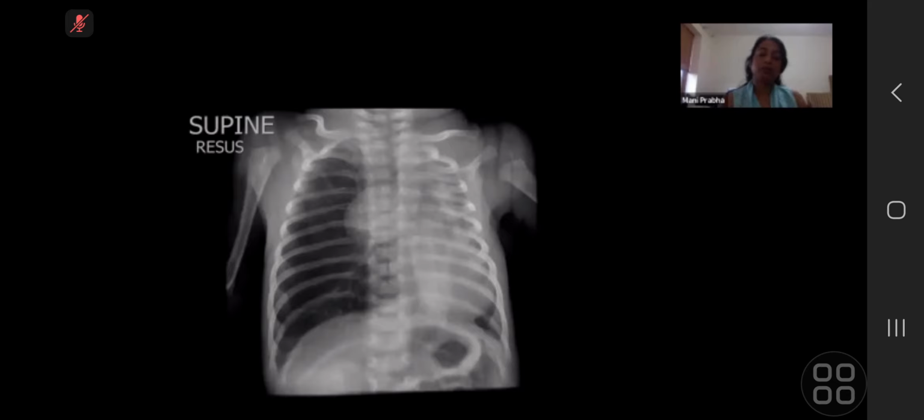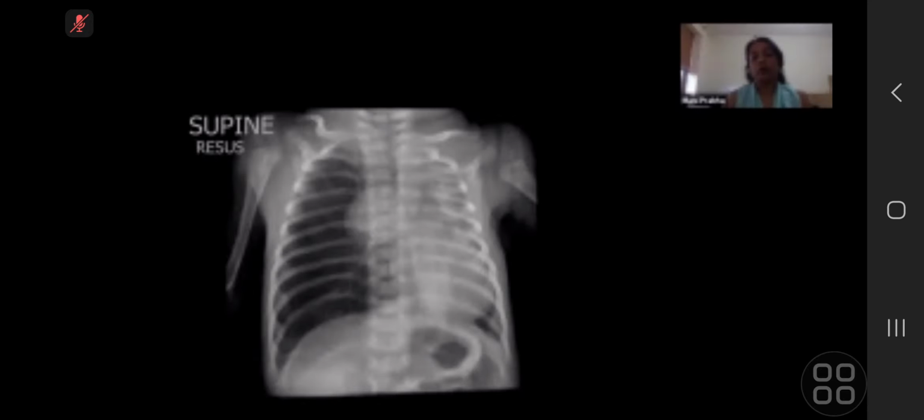Okay, mediastinum. Unfortunately the picture's a bit fuzzy, but I can see a normal looking right thymic contour. The left thymic contour is not very well displayed, but I think there might be underlying abnormalities in the adjacent lung. Overall, the mediastinum looks to be slightly shifted to the left. Okay. Yeah, lovely. We'll discuss it.